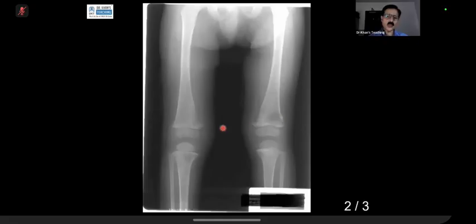So you are actually describing this sclerotic band. What is happening here? Yeah, I think these are two areas of lytic lesions. Right. So there are lytic lesions, and you have seen a lytic lesion upstairs in the humerus also. So, what do you think? What are you now thinking?